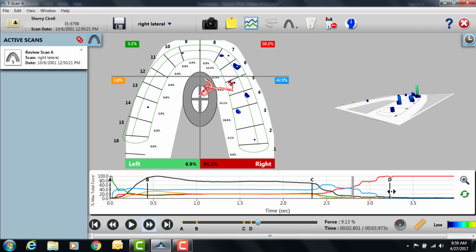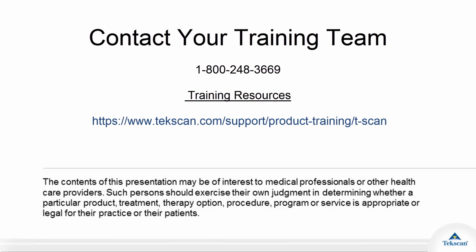But in this case, you can see the computer placed it all the way out here, which is a significant time discrepancy. That's for another video. We'll talk about the differences in the C to D times and what that means for the patient.